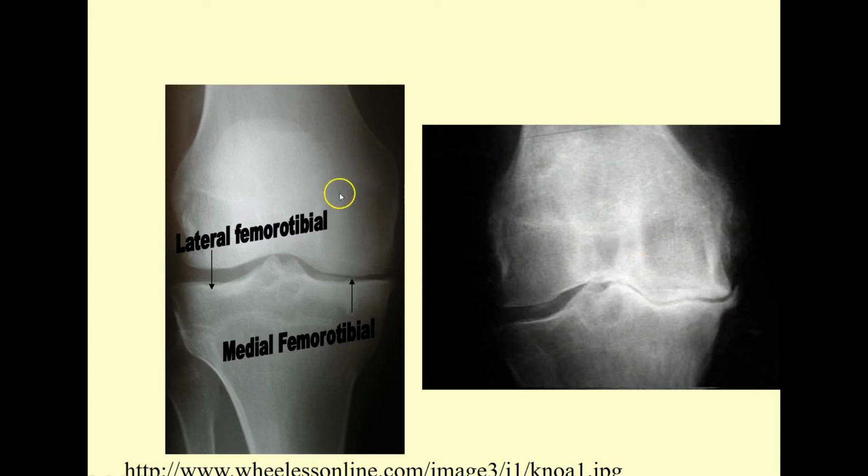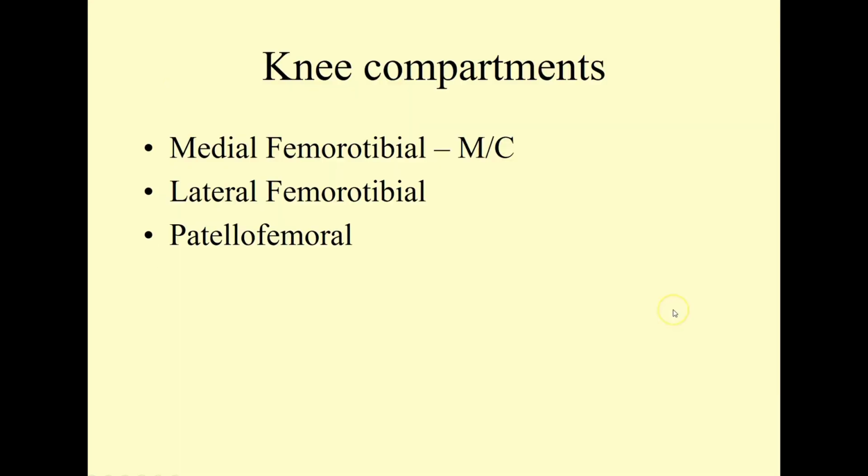I partnered this early DJD image with this further down the road. And in this case, the osteophyte has grown around. And I don't think there's any intelligence to this, but it does serve to reduce joint motion, but also will tend to reduce the joint's ability to subluxate as well. Clearly rounding of the medial tibial eminence, and we're seeing change in contour on both articular surfaces.